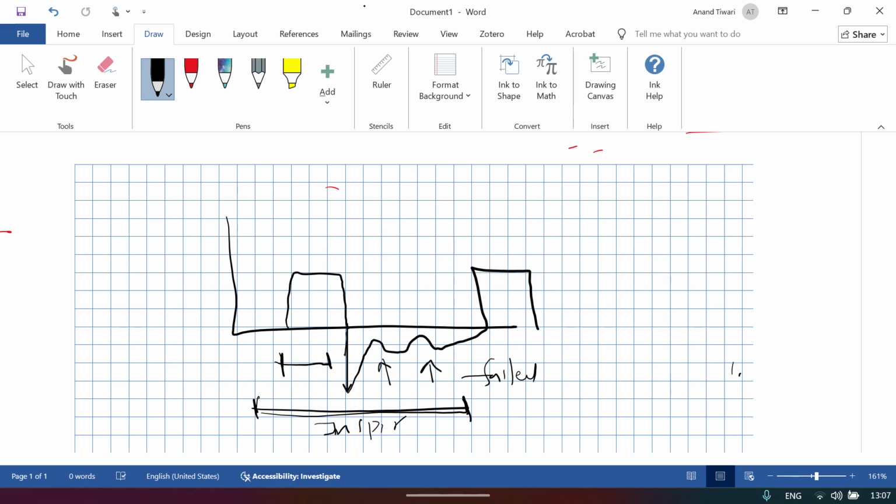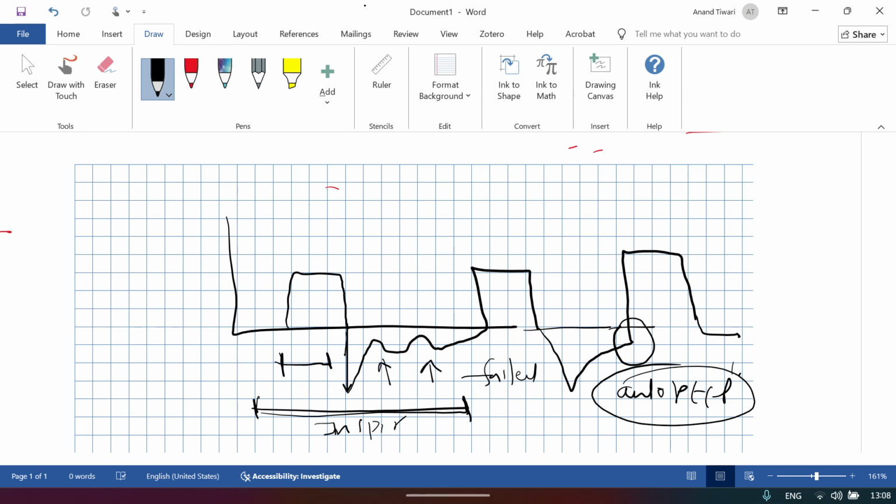What else can we see from the flow time curve? We can see the compliance problem, the resistance problem, and the failed trigger. Suppose again you see the expiratory limb is not touching the baseline, there is again inspiration started, then there is the next breath. Similarly here you see that it has not touched the baseline. So this also signifies auto-PEEP or dynamic hyperinflation in a COPD patient.